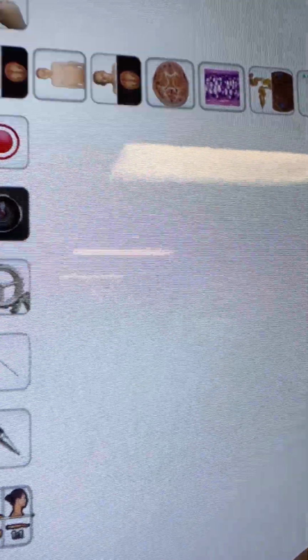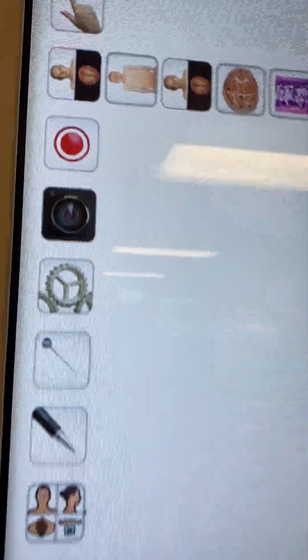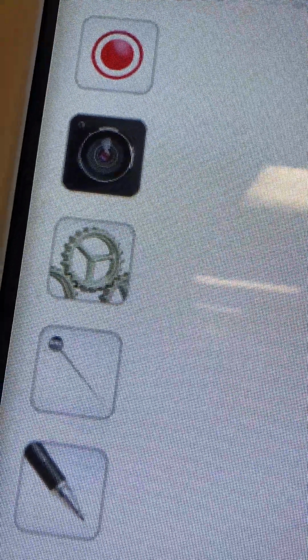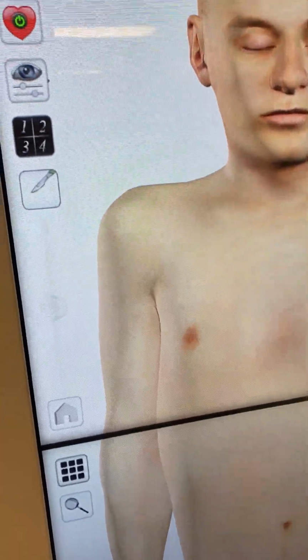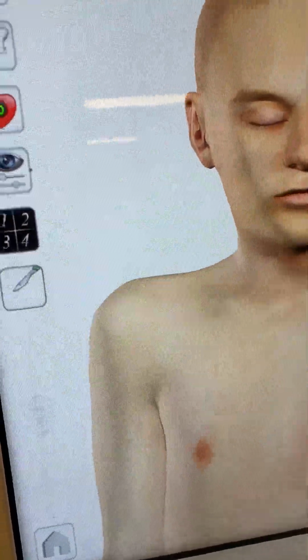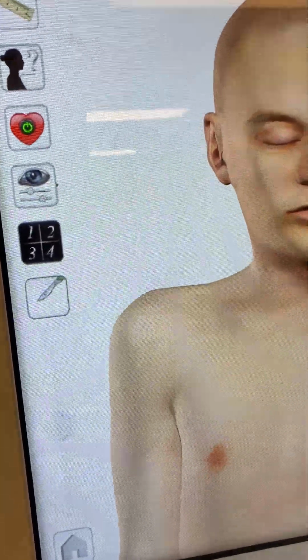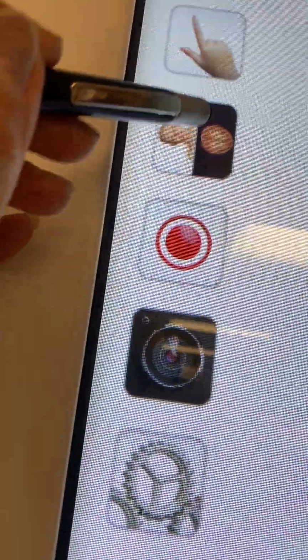Let's look at the first one. So the first option, you can see the cadaver is here. The first one is how to use the 3D layout. Once you have that, the whole cadaver is in here. If you go to different layouts, like 2D layout or histology, whatever you do on here, use other icons, then you won't come back to the full cadaver again.